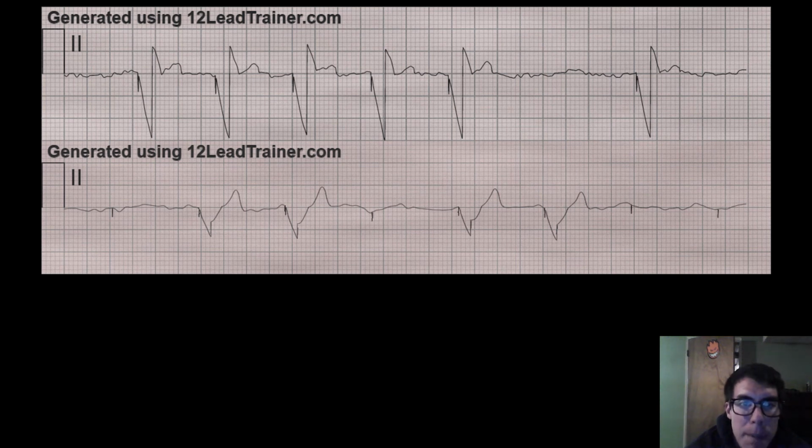So there are different things that can go wrong with pacemakers. There's something called failure to capture, and there's also just malfunction, which are the two most common things. So up top here, that is just a failure basically. Pacemakers' jobs are to keep a certain rhythm to the heart, keep it beating at a certain and regular interval.